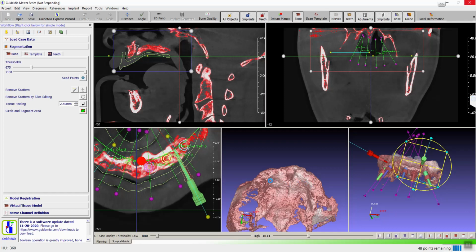So what I'm gonna do is we are gonna choose this piece for guide design, and I'm going to create a tissue model out of the prosthesis, add 2 pieces in the posterior, then we make a combined guide with both tissue and bone level. So we're going to do a combination of that. This is quite different. It's really a special situation because of the bone. So it's generating the bone model now.